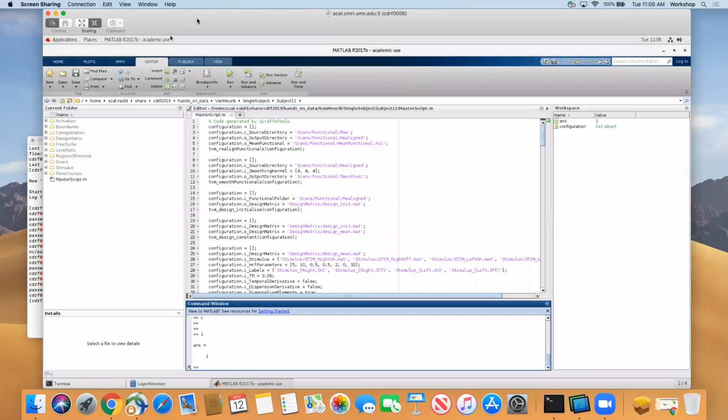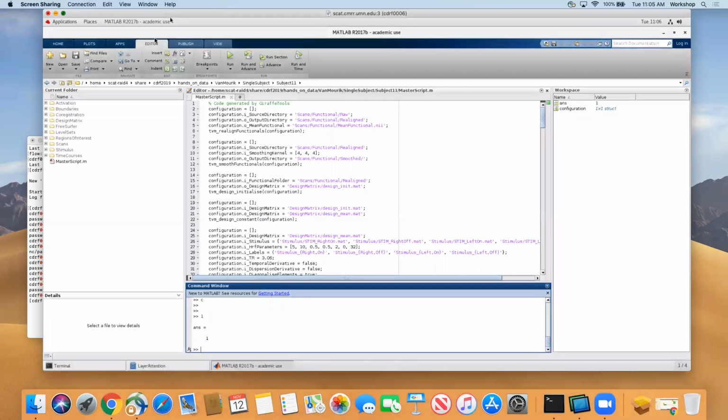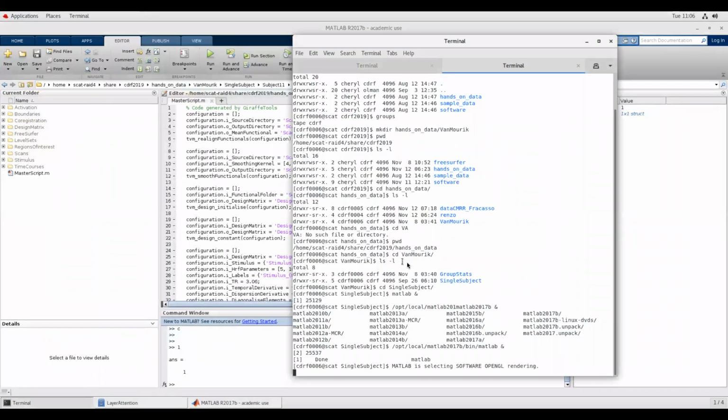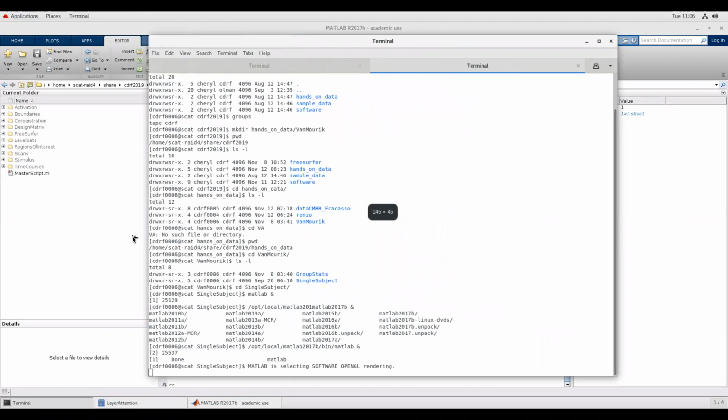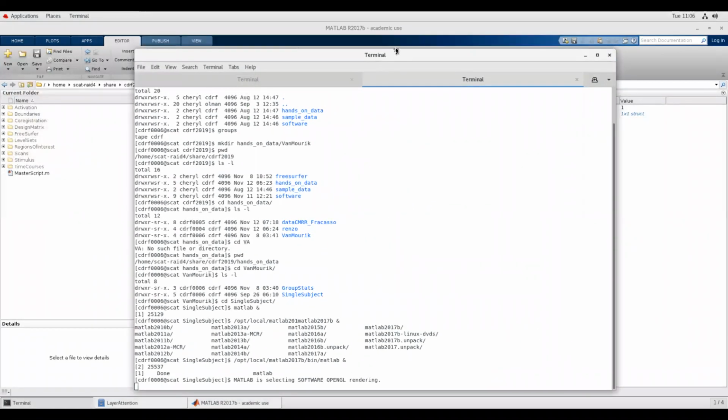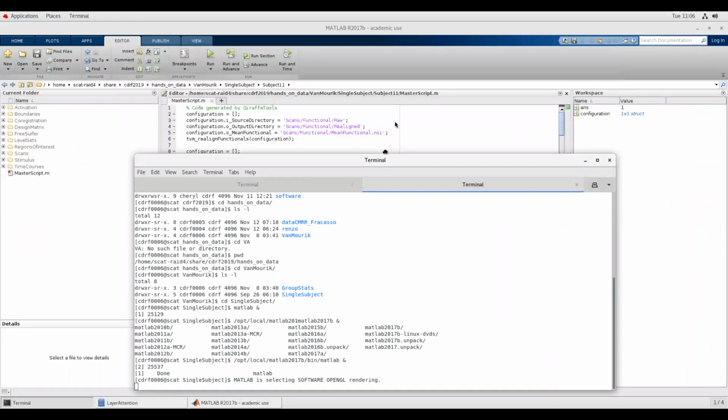And so then you just want to get your screen to a state where you want everybody to be, and then just freeze there. Then we'll go around the room and make sure everybody's in one place. Yeah, that's very structured. I like it. So just minimize MATLAB, everybody wants to be in a terminal, and you'll show them how you launch MATLAB.